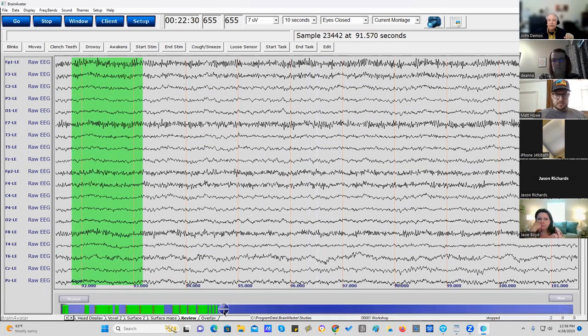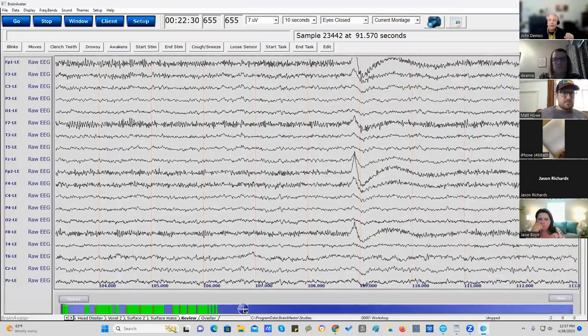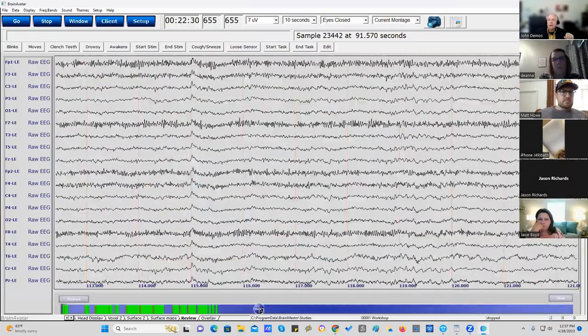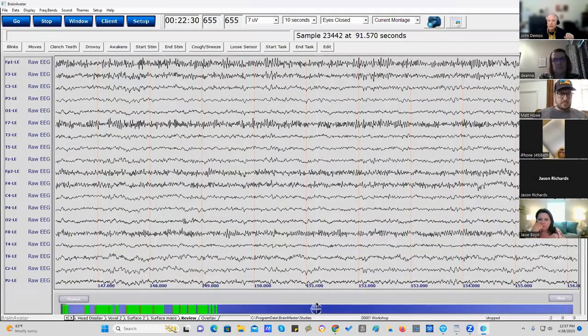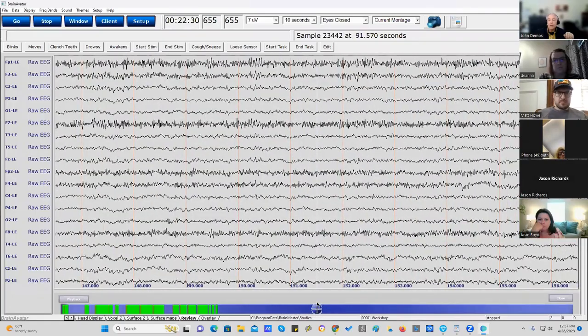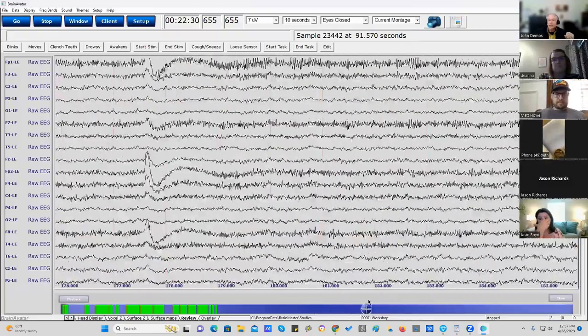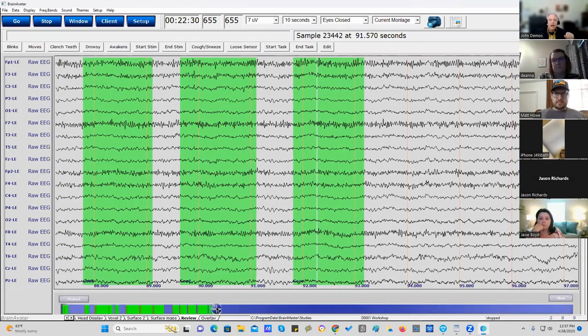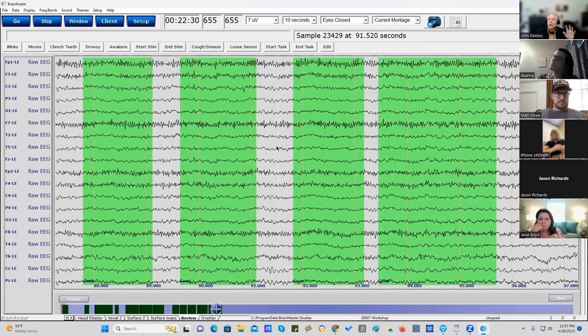Now, notice what's happening to the EMG at FP1. It's getting a little bigger. And I know, because I peruse the whole area, that the EMG is going to get worse and worse and worse. Can we all see that? FP1, FP2, look at how bad it is. And so I'm not interested. It's getting worse. I'm going to stop right here. I know I have a minute of data or more. Do I want to take this little piece here? I can. I don't have to. So it's all going to average out and be what it should be.